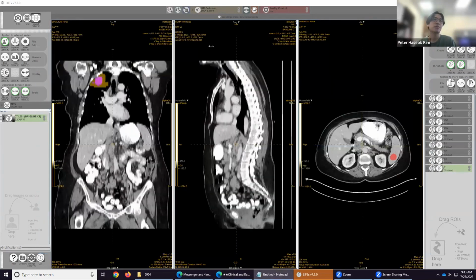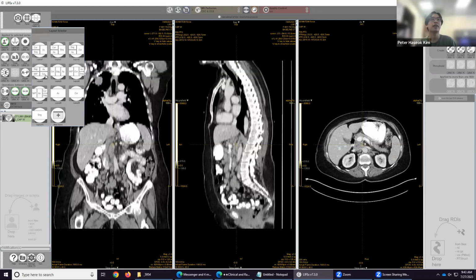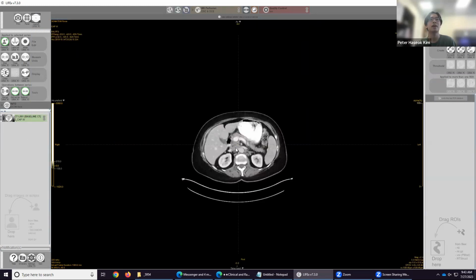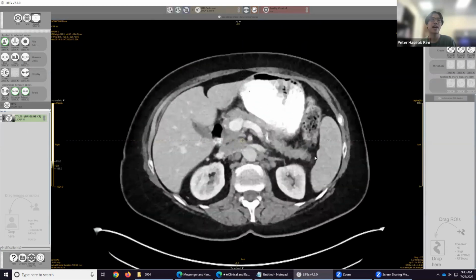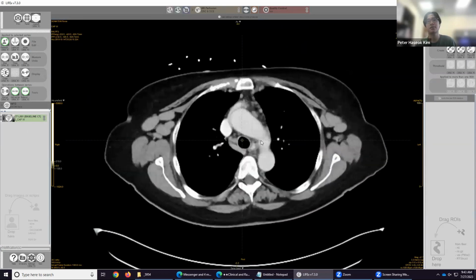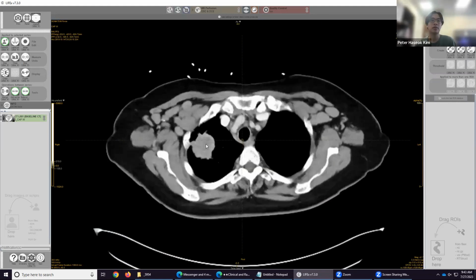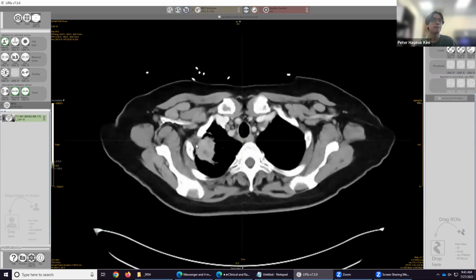And so we're looking for something. And so as you can see, this CAP W, it's a fine DICOM folder to use. Anything CAP, chest, abdomen, if it says axial MPS, like all those should be fine. As you can see, the resolution's pretty nice. So here is the right upper lobe lesion. And so, cool. So we have the right view.